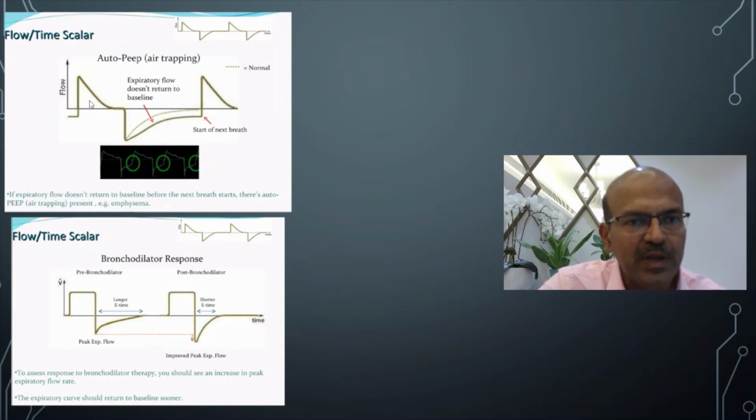So in this example, we have inadequate expiratory time. The expiratory time may cut off here, then you may have air trapping. Suppose your exhalation is not complete, you have auto triggering happening at this stage itself, then you have over distension of the lung, and we call it auto PEEP. Auto PEEP is where the expiration is not completed for whatever reason, and the exhalation continues. The same pattern can also be seen in a leak in the circuit as well, or auto PEEP. Both can have a similar pattern.